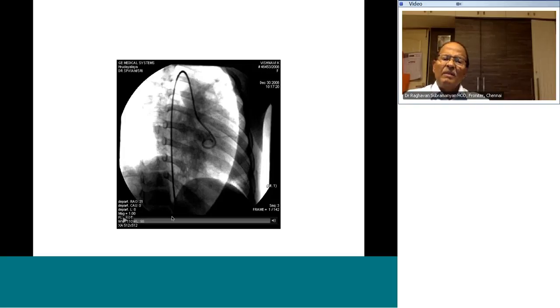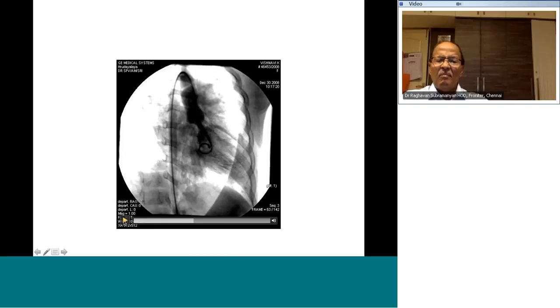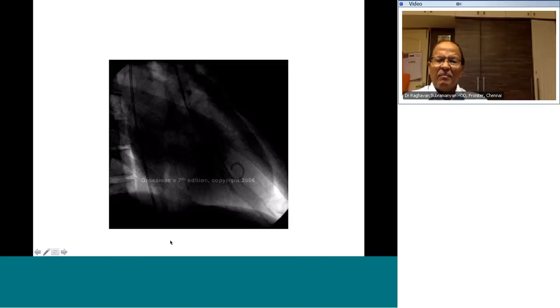Okay, this is the previous angio. We'll go back one more angio. When you look at this angio also, I showed you earlier.